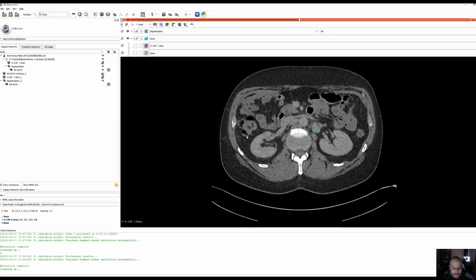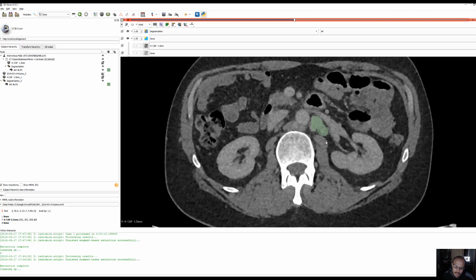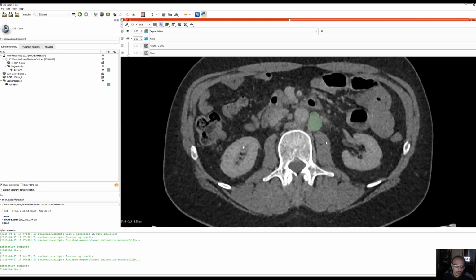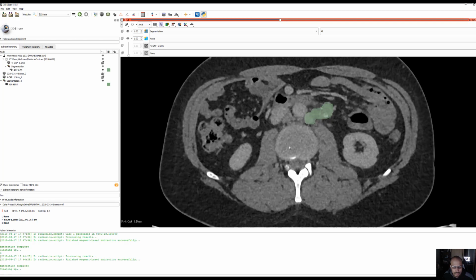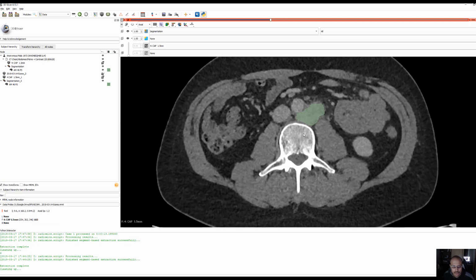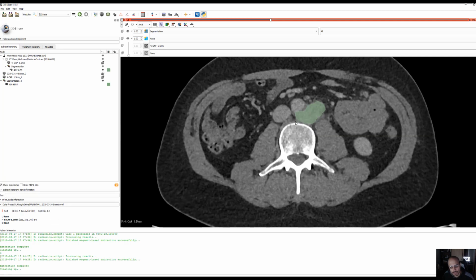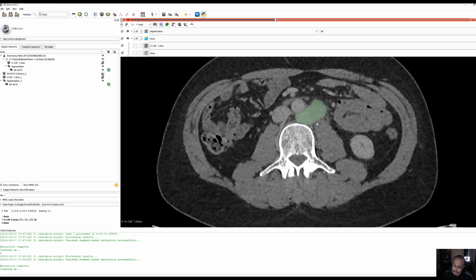Okay, so I can see that maybe in some voxels you've got a little bit of additional tissue out. I know it's difficult, but you might want to avoid it, and that's 1.5 mm, so that's all good. Yeah, I think how well you draw that will be important, because you don't want to catch any of the prevertebral tissue in it. So it's better to lose a little bit of margin of tumor rather than to add a little bit of non-tumor muscle or something else in it.